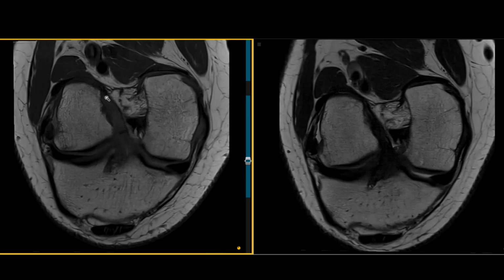So if you look at the image on the left, there is this grey, fairly homogeneous healed ACL, which is of higher signal intensity than the native PCL, whilst the image on the right has a low signal intensity ACL, which is contiguous from femoral to tibial footprint and is of similar signal intensity to the PCL. So the image on the left would be classified as an ACL OAS score of 1, whilst the image on the right would be a score of 0.